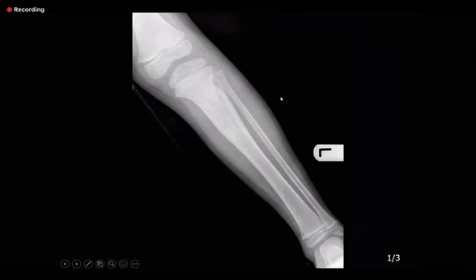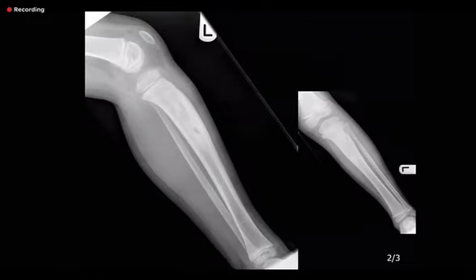Though on this exposure, it's difficult to pick up, here you definitely see it is tunnel. Cortical tunneling is a specific sign of osteomyelitis. Tumor will not do it. If you see cortical tunneling, and with that you see thickening of the periosteum, call it. It's an absolute specific sign.